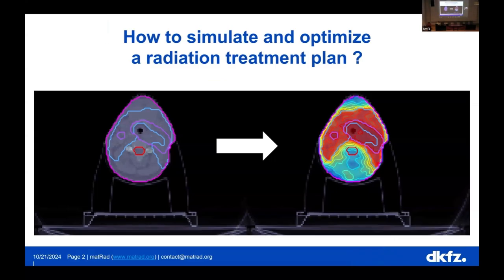So what do we go from? Some image. We have an image of a patient. This is a CT. It doesn't really have a very good window setting. There's a question. Let's check it out. If one has MATLAB software already installed, I will soon repeat it.